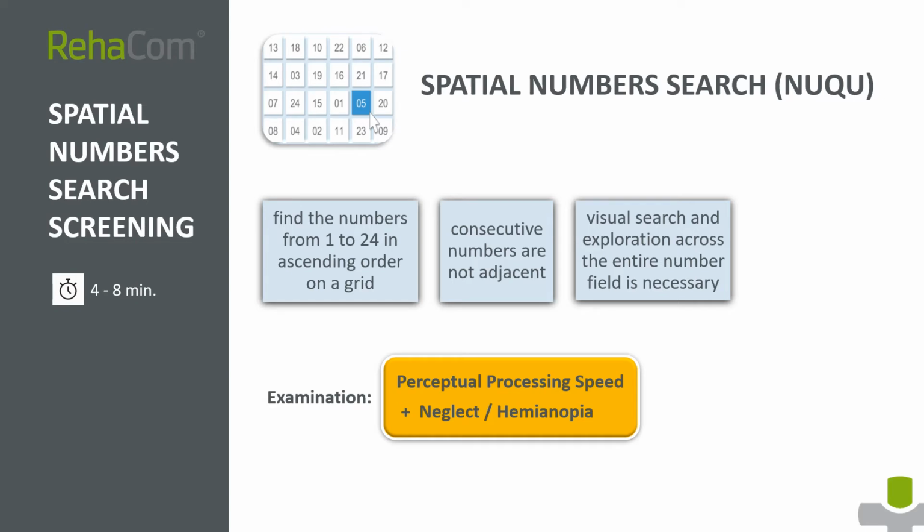An increase of the regression line suggests that a patient's attention performance declines during the task. Z-value 3 is based on the comparison of average search times in the right and left half of the screen. An obvious slowdown on one side indicates either neglect or hemianopia. As applies to all the screenings, depending on the screening results, the system recommends appropriate training modules. Following this test, for example, the training modules Attention and Concentration, Vigilance 2 and/or Saccadic training.